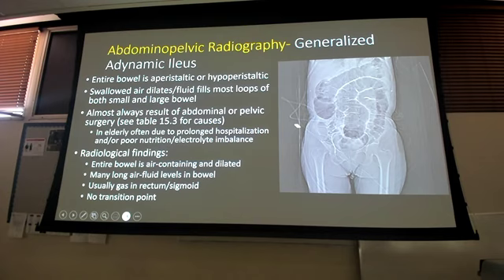So, and you can't even really say, well, this has got to be large because of that, because when this stuff dilates, everything gets pushed and moved all over. So you got to try to use your knowledge of what it looks like under imaging with the haustra versus the valvulae conniventes and try to figure out which is which. Really, all you really need to do is figure out, is this both or is this just a small bowel? Okay?